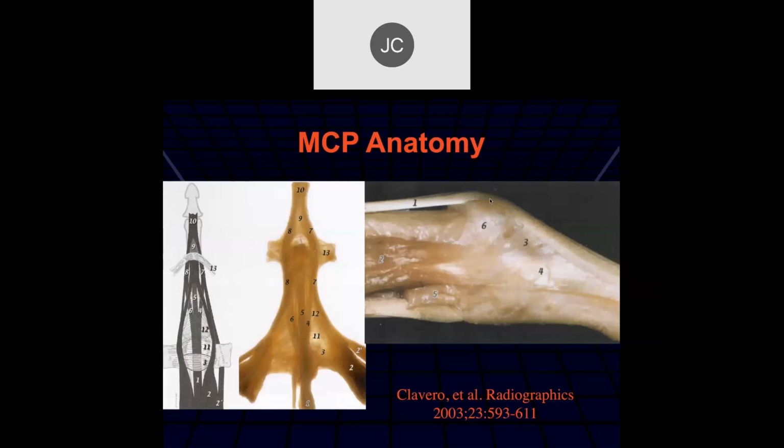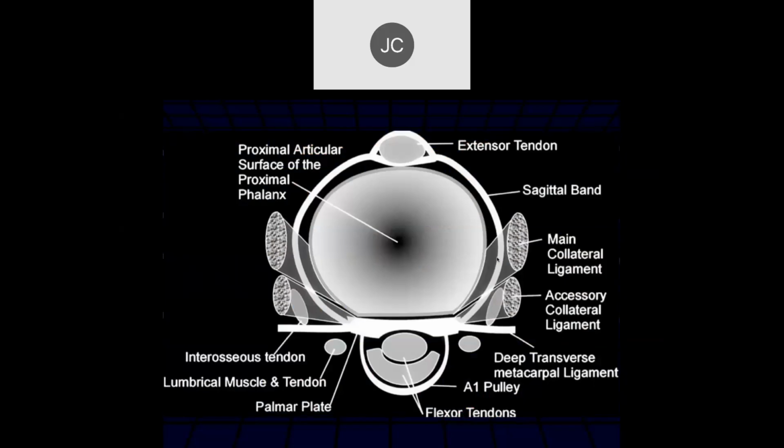And you could see if you actually make a fist with your hand, if you didn't have something holding that extensor tendon right over the distal metacarpal head, then that tendon would be pulled downward and would probably flop over to one side or the other. So what keeps it stable and in the midline is the sagittal band. So we'll talk about tears of the sagittal bands here, and then here we can see those other tendons and the interosseous muscles on the side of the joint.